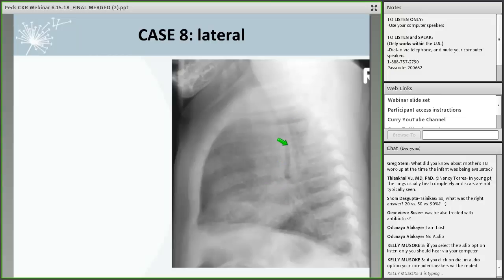So lots of adenopathy may be compromising the airway, causing air trapping in the right lung, and then in the right lower lung region, you can see some atelectasis consolidation that was seen on the frontal chest radiograph on the right side. The upper lung, I'm not seeing much, maybe a little bit here. Okay? Go ahead, Ann. Thank you.